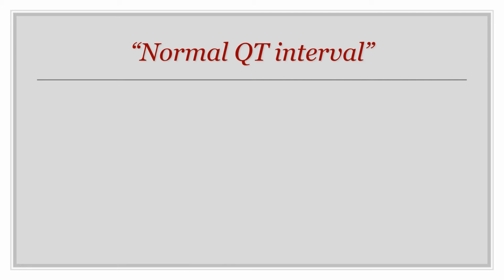So I'm left with one of two options: either double check every time I see an ECG what's normal for this particular patient and go online to find it or write it down somewhere, or stick to less accurate numbers that are easier to remember, and I've chosen the easier option.